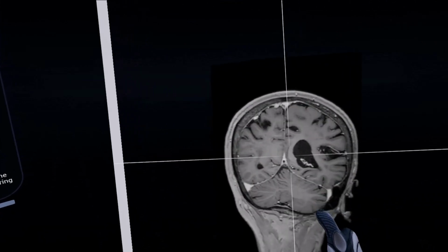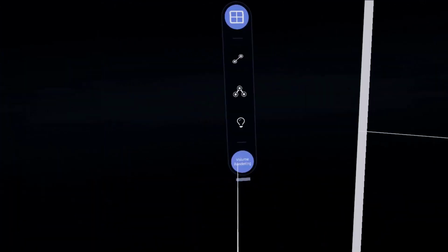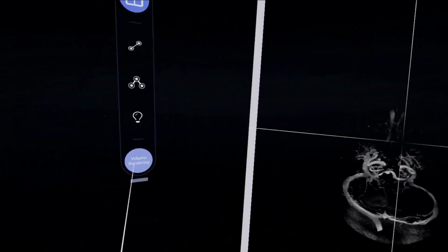Example of the isotropic 1 mm contrast-enhanced T1 weighted MRI sequence of the brain. This sequence is routinely used to highlight the lesions of blood-brain barrier disruption, such as different tumors, acute inflammatory lesions, etc. One could easily rotate all the scan volume and cut the region of interest using the slicer tool. The same sequence is post-processed in the volume rendering tool.